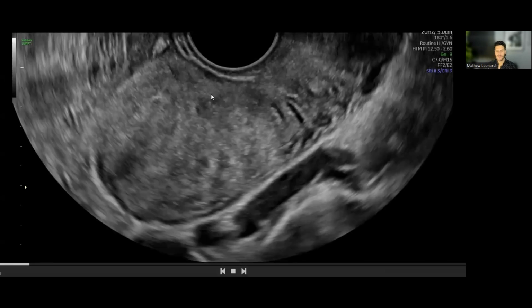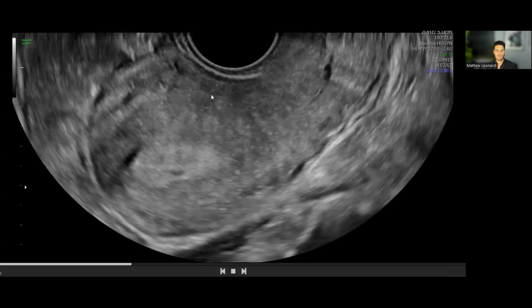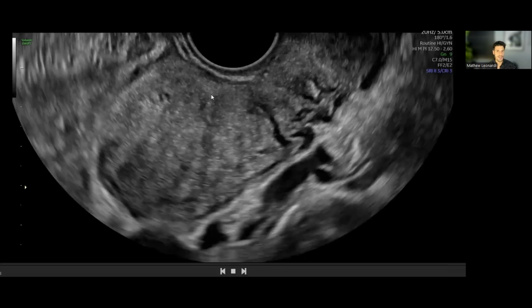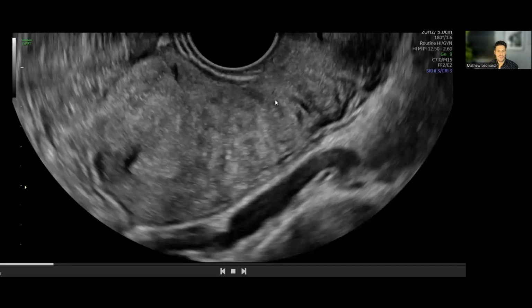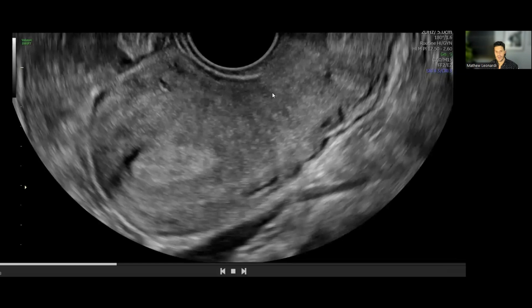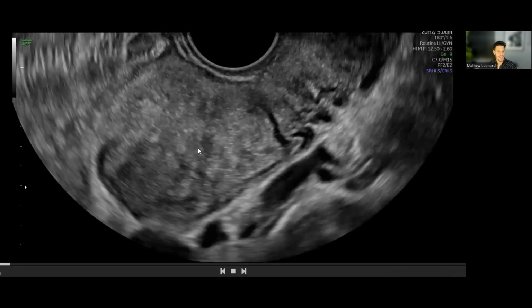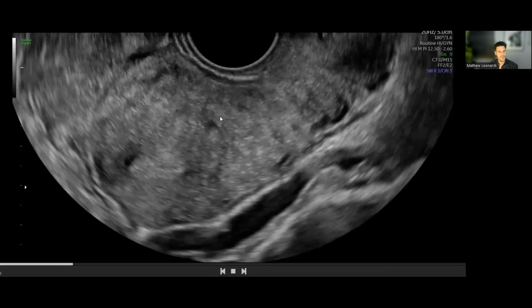In this case, because I have a lot of confidence about the presence of a polyp, and if there was a second polyp, would it change the plan for the patient very much? Probably not. So it might be a little bit of a surgical surprise if a gynecologist performed a hysteroscopy in order to identify a second polyp. Probably not super pleasant, but also not going to be such a game changer moment. They both can be dealt with at the same time. Would we recommend something like an IUD in this case? No, probably not. The IUD might achieve endometrial thinning, but the patient might have ongoing spotting because of the polyp. So I don't think an IUD would be a great option for this patient at this time.